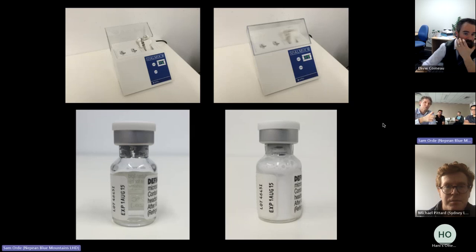One of the things that we have to do is activate the agent first. If you look at the bottom left here, this is what the little vial looks like. It costs about $150 in Australia, so it's not super cheap. If you can see just at the bottom, there is this clear liquid, maybe about 1.3 mils, and then it's got the gas above it.